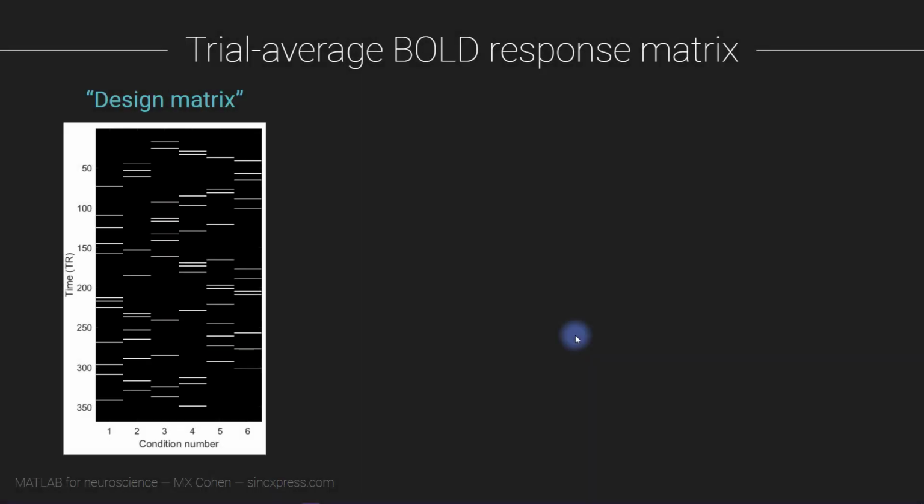I mentioned in the first video of this module that in the experiment, the research participants saw rings of different eccentricities. And so we're now going to start exploring that experiment design. What you see here is a visualization of what's called the design matrix in statistics.